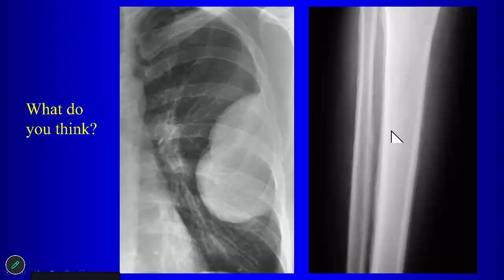So what are you going to call this, given this finding? Hypertrophic pulmonary osteoarthropathy, right? You have something wrong in the lung associated with periosteal thickening in the long bone. So, what could this be? Lung cancer. Lung cancer can be associated with HPO, right? So that can happen.